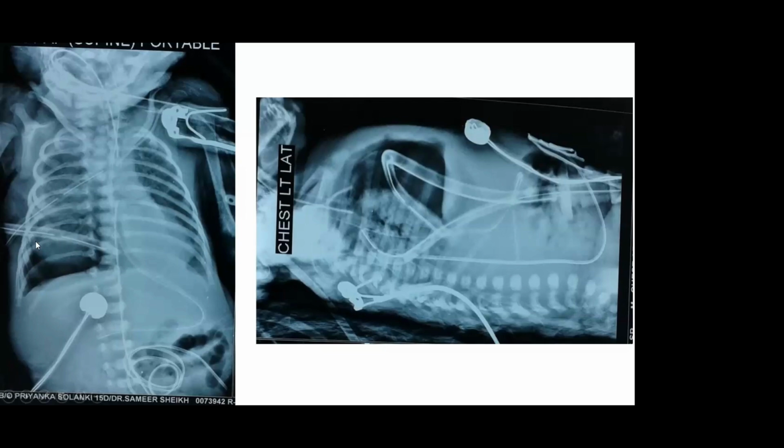Okay, in here, it looks like my ICD placement is almost perfect. Okay, it is touching the spine, or it is crossing laterally across the midline. Apart from the depth of insertion, you might feel that no, my ICD placement is perfect. And see to it that I have placed two ICDs in this baby. One more ICD is going here, but still the drainage of air is not perfect. So what has gone wrong here? In the lateral X-ray, I can identify that my air is collected here, which is seen as a basal pneumothorax.